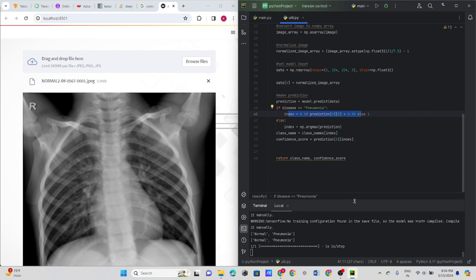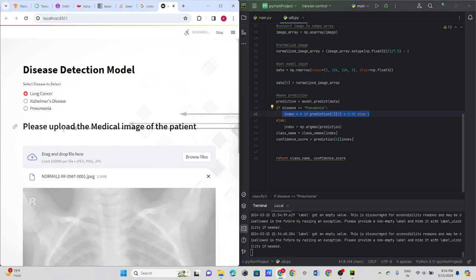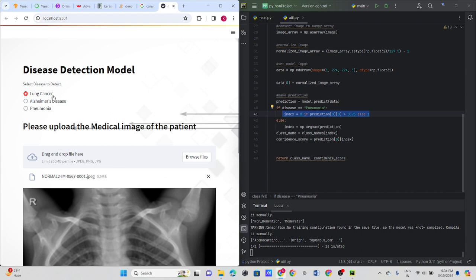And then it is a kind of optimization which I have applied here so that the performance of my model increases. But if you are having Alzheimer's disease or lung cancer, then the images are colorful. If you see the lung cancer image, it was in the form of colorful images. So it becomes very easy for the machine to learn, and not much data is required for the machine to learn here. In that case, this line of code is enough to get the highest accuracy prediction, and we don't need to apply much more of the logic which is implemented here.